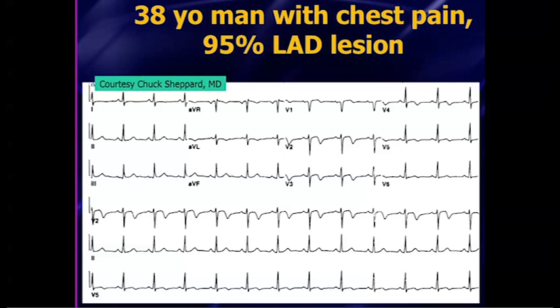He runs the aeromedical service in Springfield, Missouri, and a really, really great guy. And he sent this EKG to me. This is true Wellens syndrome.